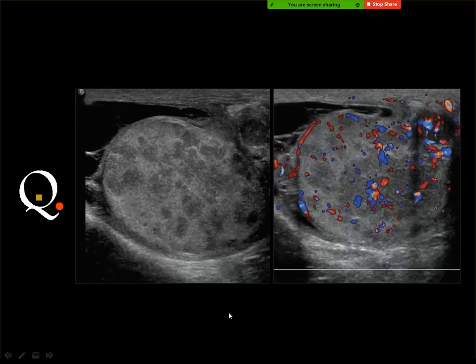Orchitis with multiple abscesses. Okay, and this is actually the testis, which is considerably enlarged and is infiltrated by multiple hypoechoic lesions, and there is some vascularity in between. And if this testis is inflamed, then you may, as you said, get some abscesses, and abscesses are more or less well defined with characteristic margin and so on.